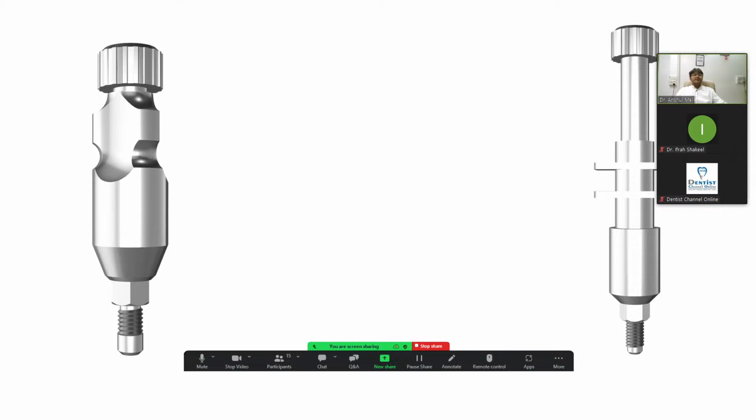So digital implantology starts either from taking the impression, or from planning the implant. For that, so many software packages are there, and you can plan and see. If you are doing free hand surgeries, viewers only are also available in the market. You have to start from the future tooth and place the implant according to it. How you can plan and place it is also a huge topic.